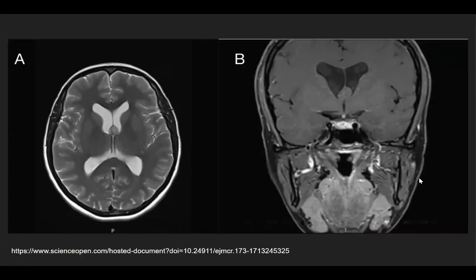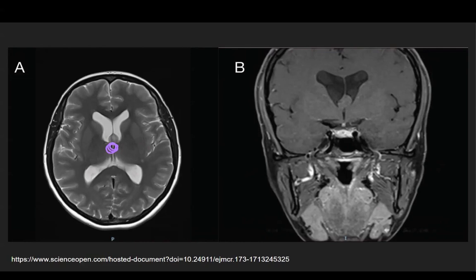So, yes, I think this one was the last, and let me see. Yes, this one was the last. This is here because this is an exact replica of subependymoma. Colloid cyst? No, it's not colloid cyst. Colloid cyst is slightly lower. This is exactly at, and let me see, colloid cyst will be slightly here. This is above. This is a very good mimic of subependymoma.